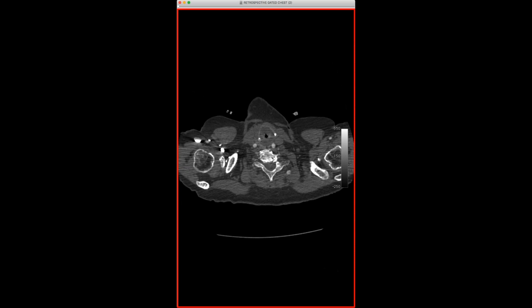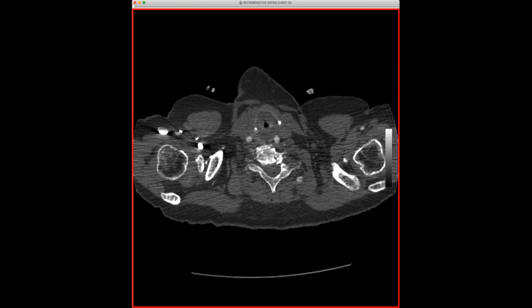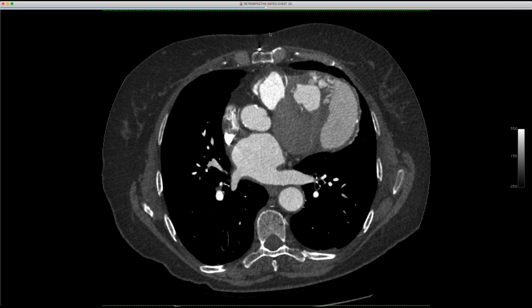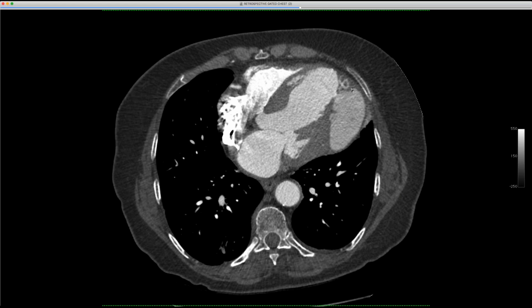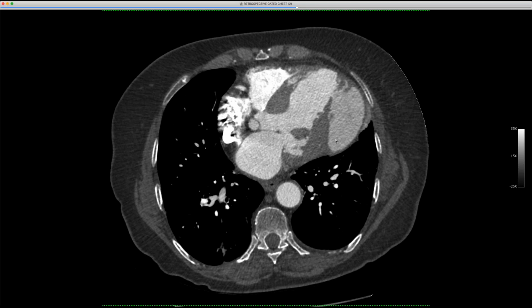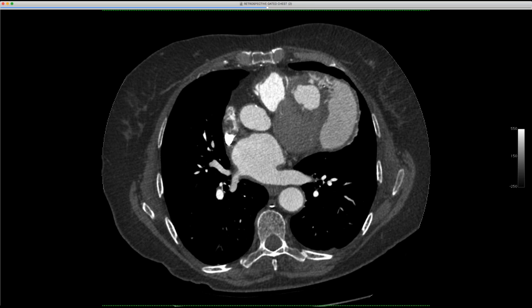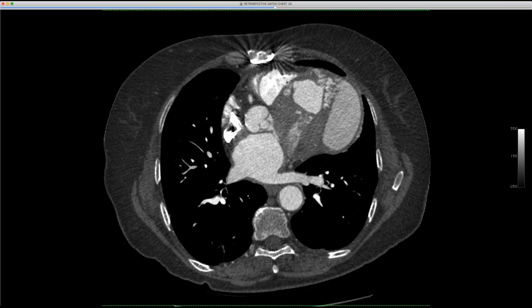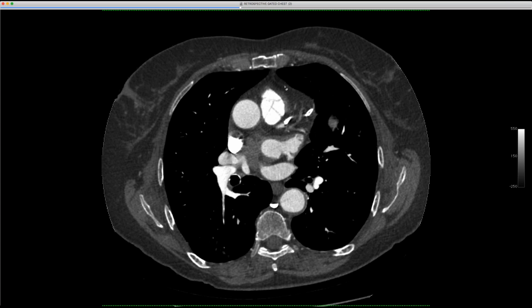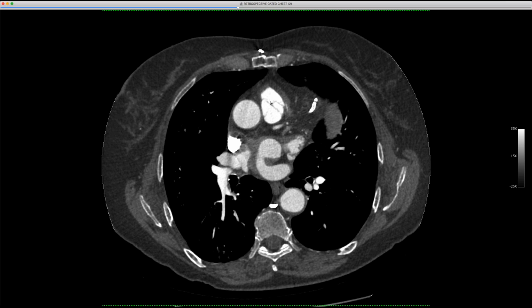And then this is a recent CT. At the time, we didn't have really any history. We just knew the patient had some kind of surgery. And this is just the craziest looking left ventricular pseudoaneurysm I think I've seen. You can see it almost gets into the wall, tracking up here. There is a patch repair at the RVOT. So the patient actually had some previous heart surgery with a pulmonic repair.